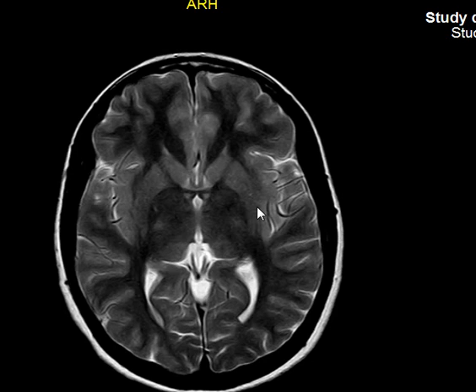Okay? They are not just anatomical lobes, not real lobes, not like the lung. You have the upper lobe, lower lobe. They are not separated from each other by a strict septum or fissure. They're just anatomical lobes. Okay?